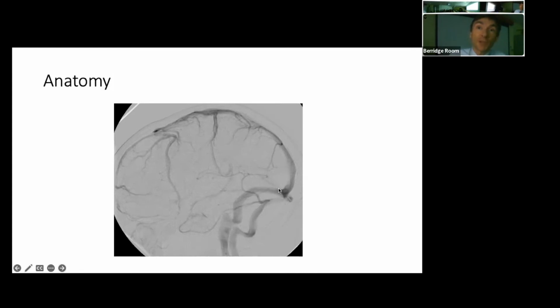On this image, you can't see the straight sinus very well, or the internal cerebral veins. So the sagittal sinus and the transverse sinuses and the sigmoid sinuses, this we refer to as the superficial venous system. And the sagittal sinus and the transverse sinuses receive these superficial cortical veins, which drain the brain parenchyma, and I suppose particularly the cortex and the underlying white matter.